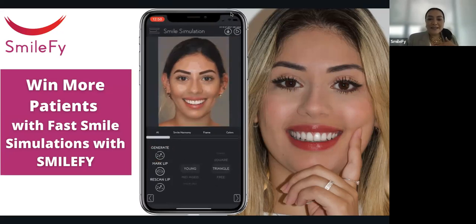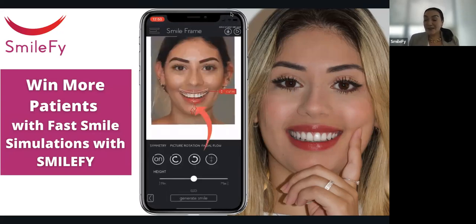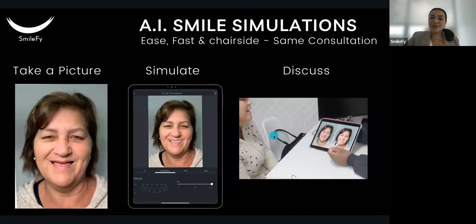I'm truly amazed by the answers. All of you agree that people change the way they are consuming. I'm pretty happy about this. So let's get started with that. I want to show you how you can do that, and we are going to practice on this case together.